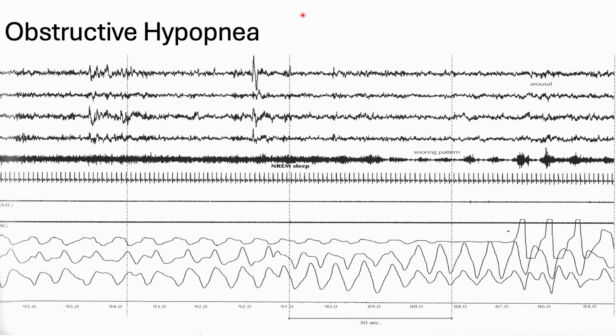So probably what happened is, I think the in-sync effort at the beginning is really paradoxing. Sometimes the airflow signal can just look strange, but if you have those little dips there, that's flow limitation, and that's usually going to be accompanied by, there you go, here's a little flow limitation, and you have this little bump in the chest belt. So if you have other evidence pointing towards flow limitation, you can confirm your suspicions that much more. Like in the effort, it's not smooth and sinusoidal. It's got extra bumps in it in some places.